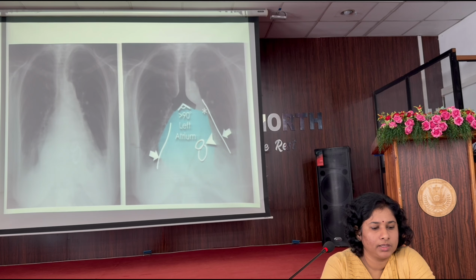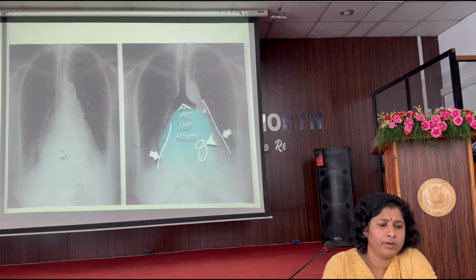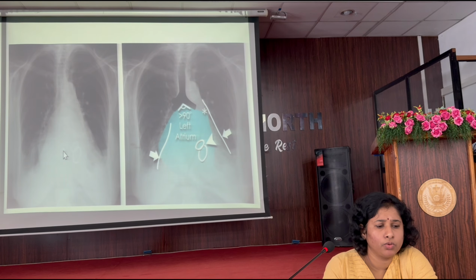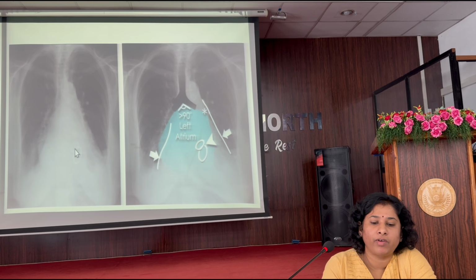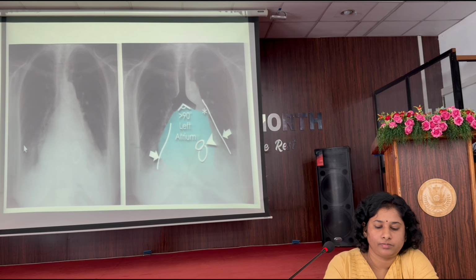This I explained earlier, I think, this X-ray. So what you see in the abnormality is a patient with SOB after recent surgery, the carinal angle is widened and there are a lot of sutures as well. And ring-like structures are due to the valvular prosthesis. So this might be a mitral stenosis patient who has undergone valve replacement, having left atrial enlargement.